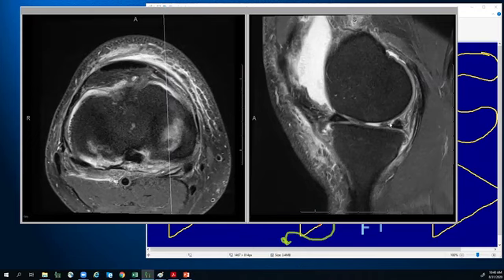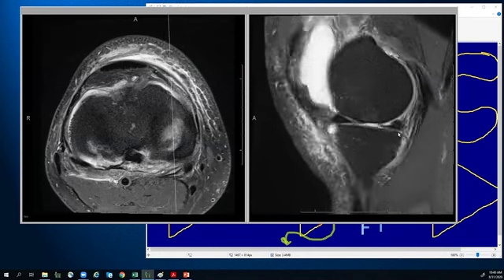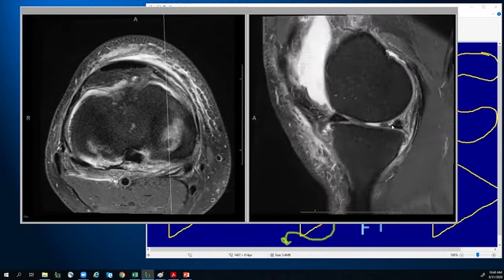So the abnormality right here, I believe I would describe this as at least a radial tear, because we're seeing kind of this vertically oriented line. It's not always starting from the outer edge of the meniscus. It's more centrally located. I believe it's going to contact the inner margin of the meniscus. It is kind of doing almost like a marching cleft sign. So this is looking somewhat like a radial tear.